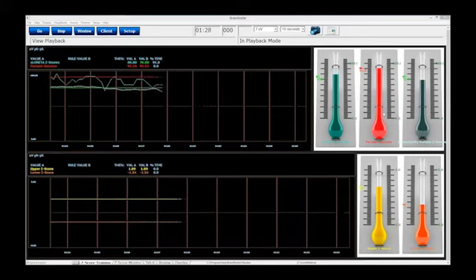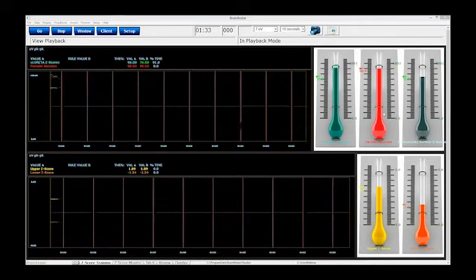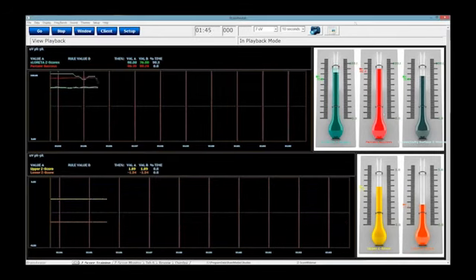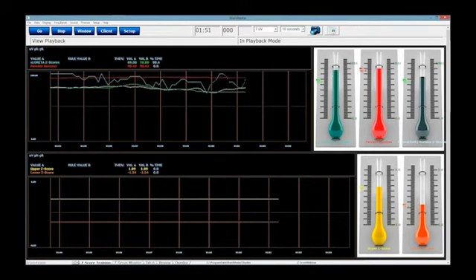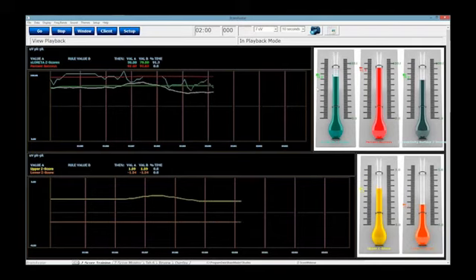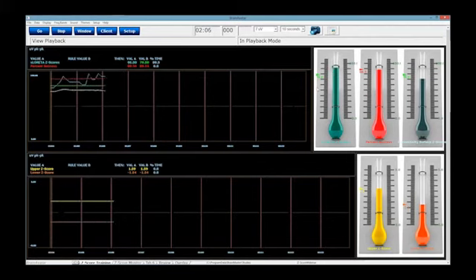Of course, when both are being rewarded, MMP will work perfectly fine, your Flash player will work perfectly fine, any third-party games will work perfectly fine. Everything's just going to kind of work. Now, the one thing with this protocol you're going to notice is that I have 2 thresholds, so I'm going to have to control them both. No, the C key controls it for both. So you do not have to worry about that. Also, the upper threshold controls for both of them. Same with the lower threshold. So all metrics being controlled are going to control the final outcome of the training.